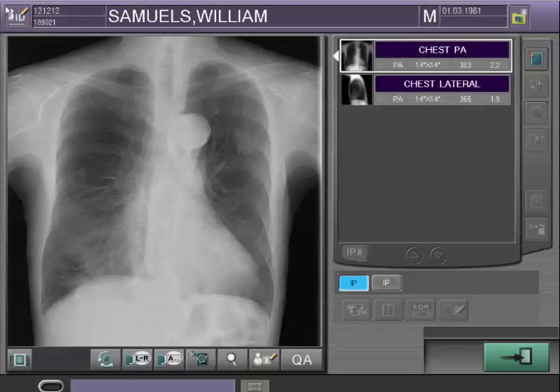In this section, we'll look at some QA shortcuts as well as the main QA area. In the lower left-hand portion of the screen, underneath the clinical image, we have 7 shortcut buttons to perform quick QA actions on a particular image.